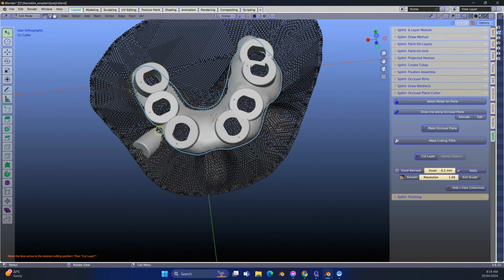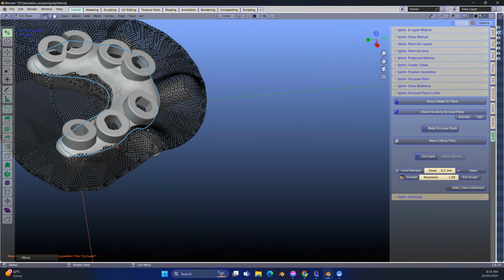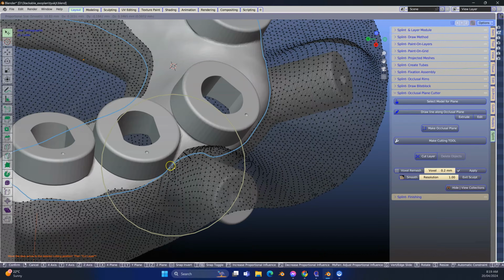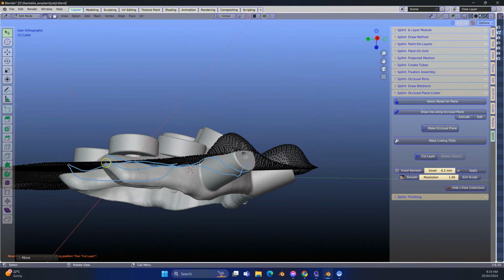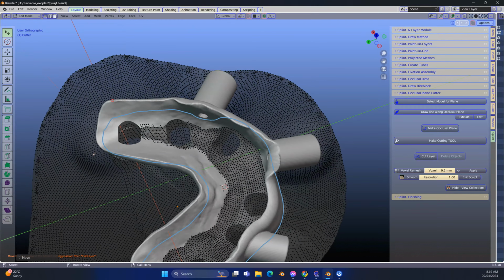Notice also on the left hand side the tweak is on, like I've explained earlier, which means I don't really need to use the G key. I can just grab the vertices up. Now this does take a little bit of practice, so if you haven't used CAD before or you haven't used Blender before, it can be a little bit tricky, but you'll get the hang of it very quickly. So left click and then grab, G key. I always use the G key, and then just manipulate these.